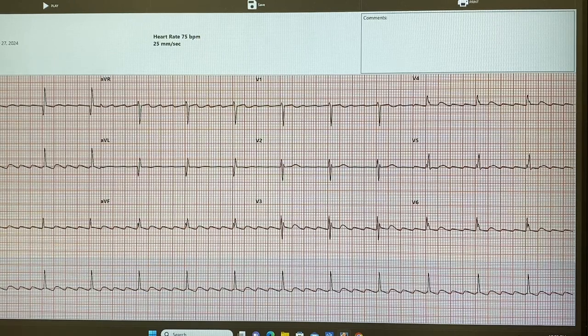And then we're looking at the PR interval, if it's normal or prolonged. You can't measure that, because there's too many P's. So that's gone, which tells you this is not an AV block issue. This is an atrial issue. And then I'm looking at the QRS, if it's narrow or not, which it's normal because it's worth one small box. So this is not a ventricular issue.